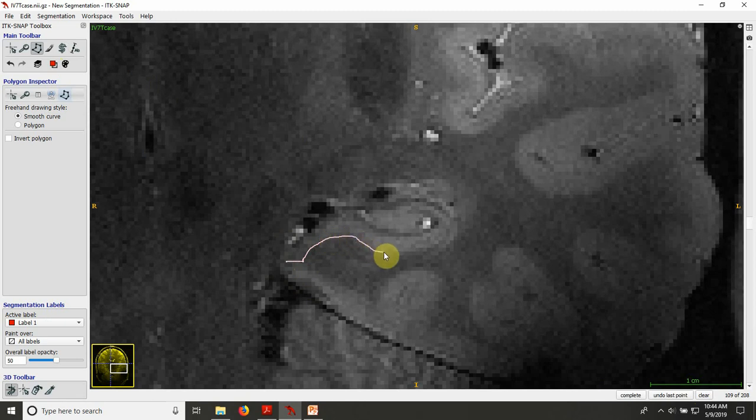I'm now drawing the line with the white matter, and I'm now using, if you can see, this line of dark voxels, which is called the alveus, which I'm not including in my segmentation. And this is the outline of the hippocampus more or less.